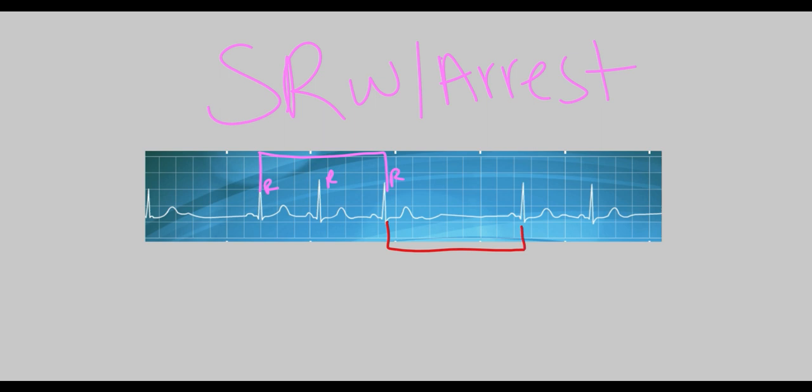So let's count the boxes to get a rough idea. 1, 2, 3, 4, 5, 6, 7, 8. So it'll be around 8 boxes.